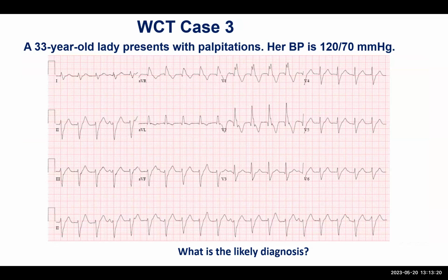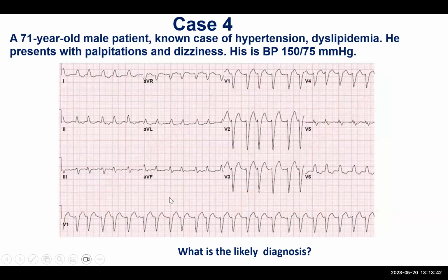This is probably more difficult than the second case. But what do you think of this? Is it a VTAC or not a ventricular tachycardia? Okay, so here's slow VT. Excellent. Most of you got it right. Actually, VT. We'll discuss it again later.